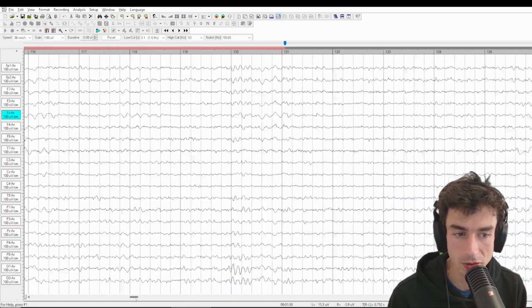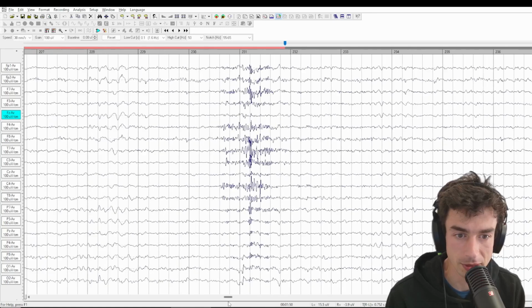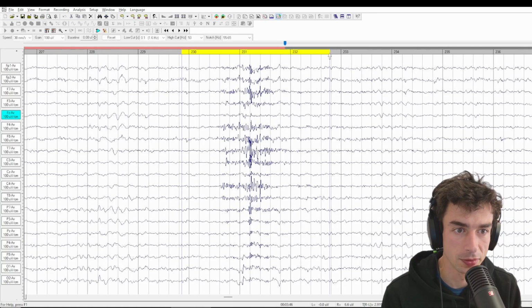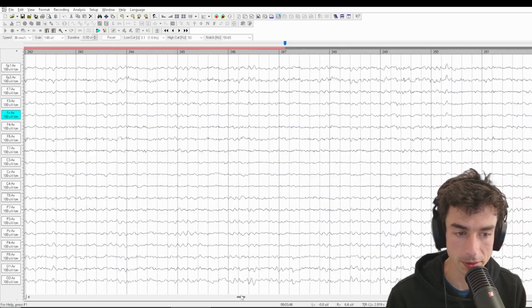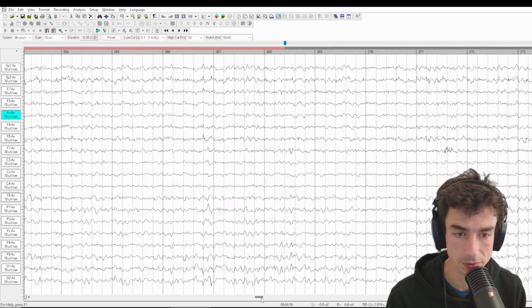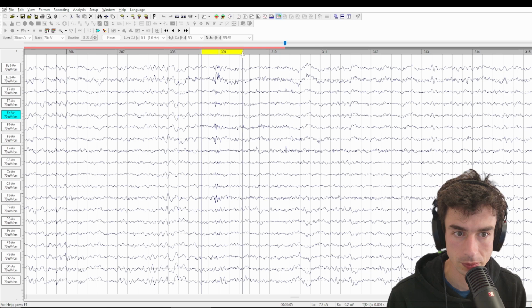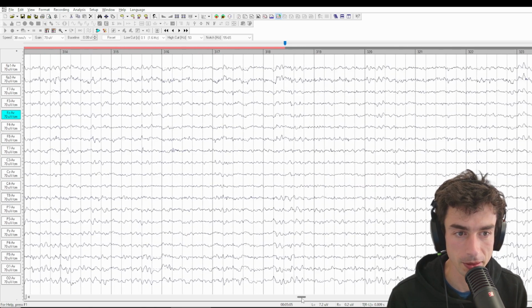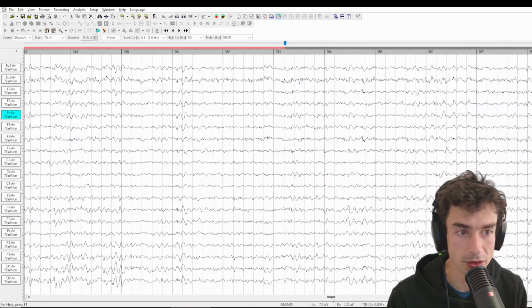I'm just scrolling through quickly to eliminate the few moments when there is broadband muscle tension. And we can see this didn't fully remove eye blink, but that's okay because it did a pretty good job.